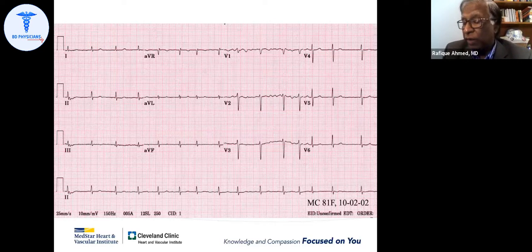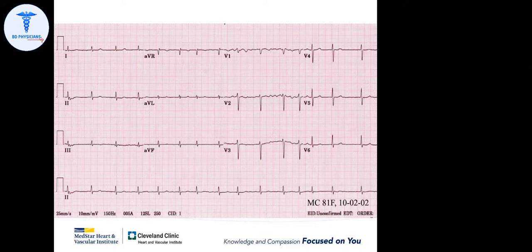And if you can tell the ventricular response is controlled, that means heart rate is under control. That will be a good thing to do. But if you tell the diagnosis just atrial fibrillation, that's good enough. So what is your name? Shafiqul Islam. Oh, good.